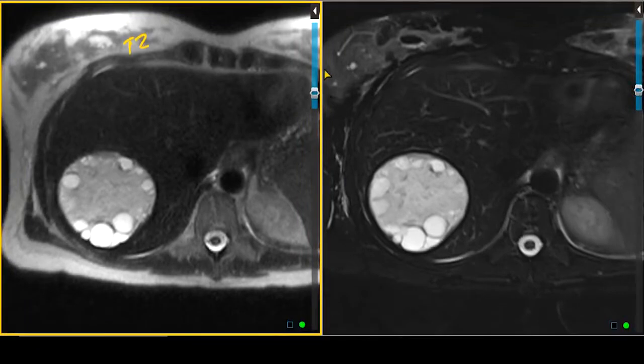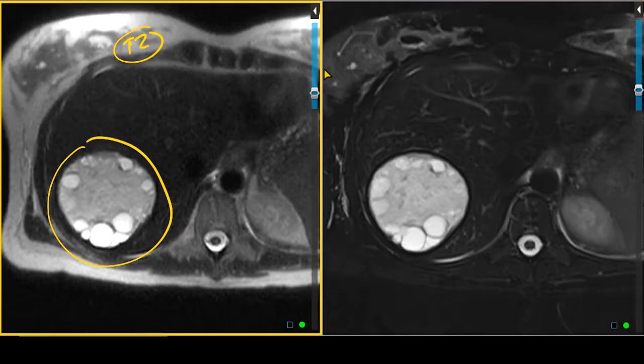On the T2 weighted images performed without fat saturation, we can see that this lesion has a very interesting appearance. So, pretty well defined. Internally, it has what I would say is mostly intermediate T2 signal seen throughout most of it over here, for example. But there are discrete clusters of more hyperintense T2 signal seen along the periphery of this mass.